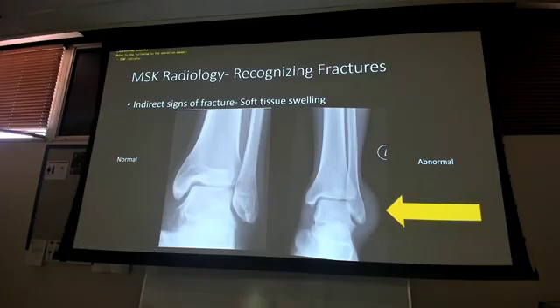Yes, sir. Is it possible here? Yeah. No. We'll talk about that more when we see what the normal anatomy of the ankle is supposed to look like. But, so these are actually two different views. This is my mortise view, my oblique view. This is just my regular AP view, but that's all normal overlap. Yeah. But saw somebody else had their hand up? No? Okay.